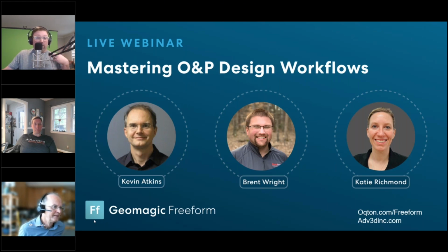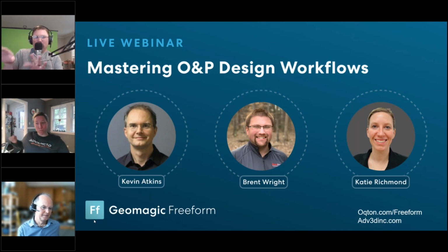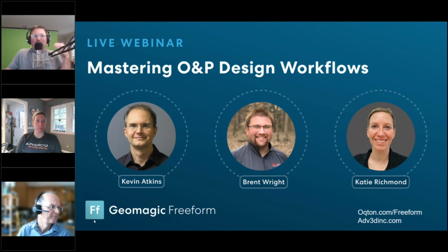Exactly. So for instance, that happened to me. I had this beautifully Dynabotted thing with a specific lock on it, and it got midway through, but I realized, hey, I'm going to change the trim line a little bit, and it just didn't work with the selection method. So I just stopped the Dynabot and did the rest manually, and I wasn't stuck. I think that's an excellent point: as long as you know how to use the software, you're not going to get yourself into a situation that you can't get out of.